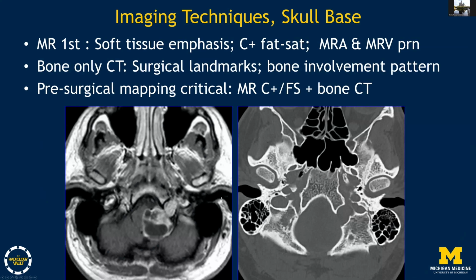So interestingly, when you look at the posterior skull base, we actually use MRI before we use CT, and that's because of its added soft tissue analysis ability to distinguish different soft tissues. We'd use fat saturation on our post-contrast sequences. We get axial and coronal with fat saturation, and this is different from some of the places that you may be practicing, but we think that the fat saturated post-con techniques are extremely valuable. Pre-con, no fat sat, post-con with fat sat, and we think they're very powerful and help make things easier to find, if you will, make them more obvious, I think, to the person looking.